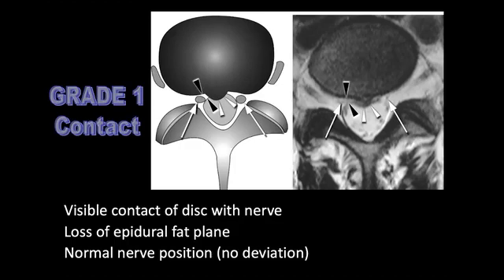So when you're reading an MRI exam, you want to identify that there's a disc herniation or disc contour abnormality. You also want to identify what it's doing to the either exiting or traversing nerves. And this is one of the concepts that Dick Herzog, one of my partners here at HSS, has really pressed into us, and it's very useful. So you can't just say there's a disc herniation. You should identify what it does to the adjacent nerves.